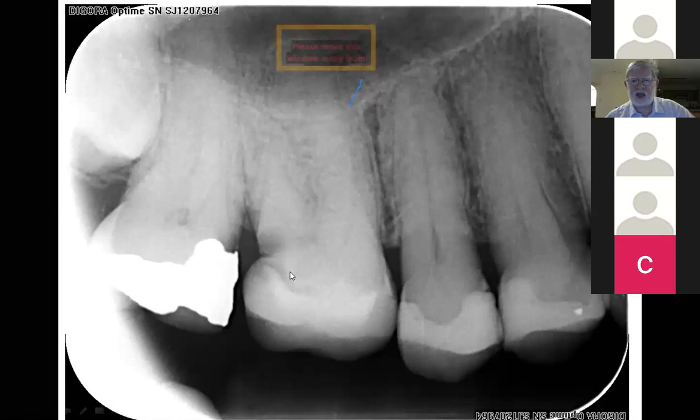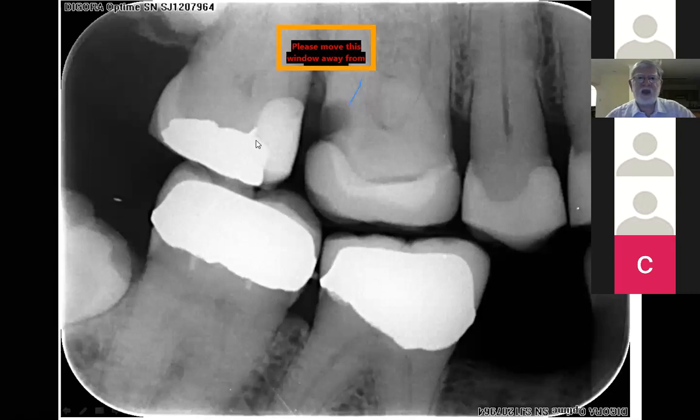So that's a PA I took at the time that was showing me no periapical pathology. He came in for an examination. He was having no symptoms there. And this is what I did. I opted to not weaken that part of the tooth further and came in with what I'm regarding at the moment as just an interim provisional restoration. It's a final filling material, but I'm regarding this as interim, and we've tackled the decay there.